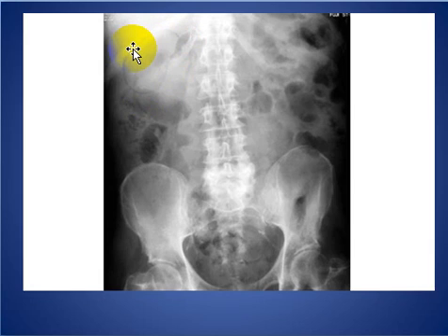We call this emphysematous cholecystitis, and it is caused by infection and can be associated with stone or without stone. It is also associated with diabetes, and we can also diagnose it on ultrasound and CT scan. So this is a crucial finding. It is emphysematous cholecystitis with infection with gas-forming organism, and there are some degenerative disc disease changes involving the dorsal spine with calcification in the pelvis.